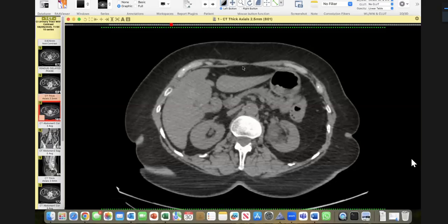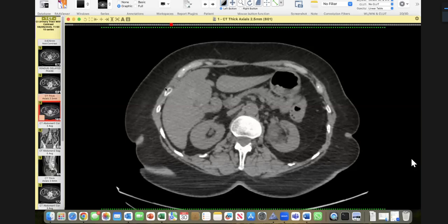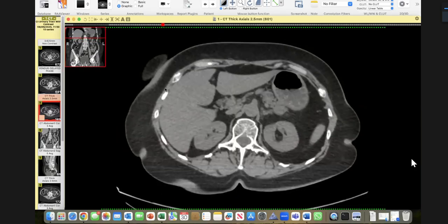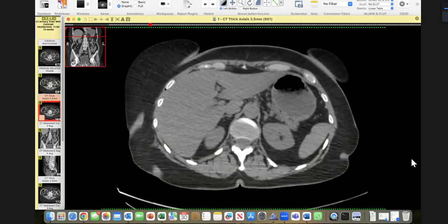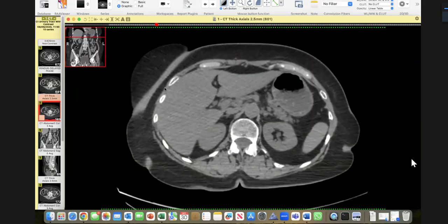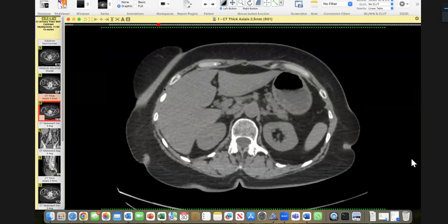Candidate 3. Hello, good evening. Yes, I'm here. Okay, candidate 3, this patient is a 32-year-old, correction, female, with bilateral hydronephrosis on ultrasound. So CT was done. Over to you. Yeah, okay. Shall I request contrast? Yes, please.